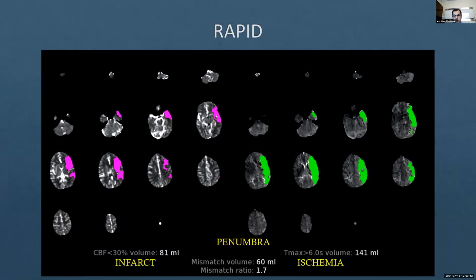That's the goal. So this is an example which is not a good example, in the sense that this is dead tissue, or we presume it is dead tissue, but this is a pretty big number already. Even though it's much bigger on this side, you have to see a big difference between them, 60, but it's a pretty high number as it is.